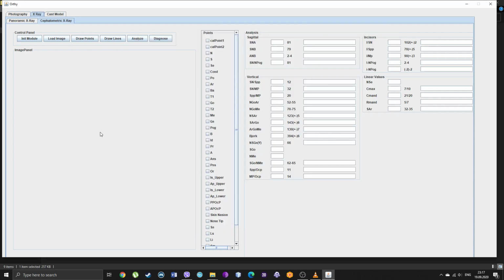So, how do you make an analysis in this type of software? Basically, press this. I must point out this is very important: you must do everything as I say, because if you skip a step, there is no protection in the program from bugs.